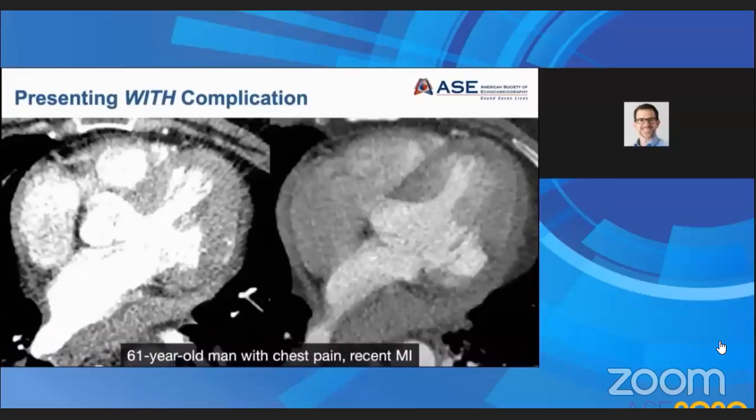Next. So here's an example of a patient presenting acutely ill. And often these patients undergo pulmonary embolism protocol CTs, as that's kind of the default in the emergency department. Patient with a known recent myocardial infarction, they have hemopericardium. Whenever I see high density fluid like this, you can see most of it along the posterior wall of the left atrium. Now, this is one of the things that scares me more than anything as a cardiothoracic radiologist.